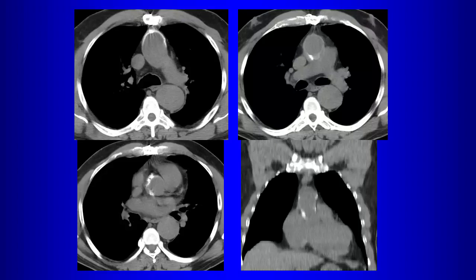Always important whenever you're doing CT on these cases for acute aortic syndromes, or on a patient who has had surgery on the aorta, the protocol should always include a non-contrast CT first. When patients have had surgery, you want to be able to identify the surgical material. You don't want to confuse this with contrast or contrast extravasation when you give contrast. So you want to know where the surgical material is, and this also helps you determine what kind of surgery was done. So the non-contrast images are important.